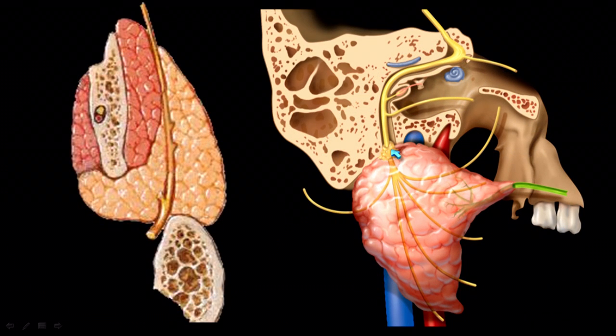So at the stylomastoid foramen, again, just like all those other cranial nerves, we look for a good fat pad at that location. We want to see nice fat below every foramen of the skull base. It pierces the back fascia of the parotid, and then it splits in that pes anserinus. All those branches: temporal, zygomatic, mandibular, buccal, cervical, occipital, all of those branches that extend out over the face.